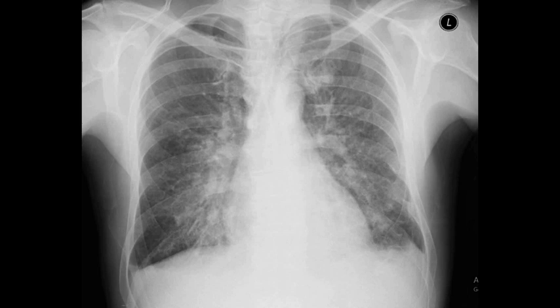So in this x-ray, it is a pathological one where we have pathology on both lung fields. First of all, also the heart silhouette. The heart silhouette should be half of the whole thorax diameter. It is called the cardiothoracic index. Here it looks like it is a little bigger than that. So the heart silhouette is enlarged. That is important, maybe the patient is having heart problems and the heart is dilated, and the heart silhouette will then be larger.